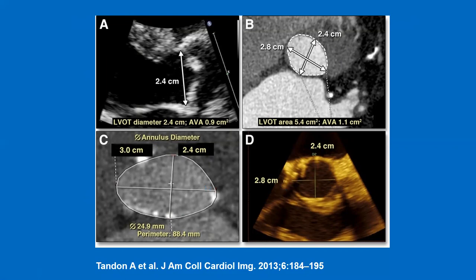CT evaluation of LVOT area in another patient exemplifies here the ellipsoid geometry, which is seen also in three-dimensional echocardiography with a minor and major axis of the ellipsoid.